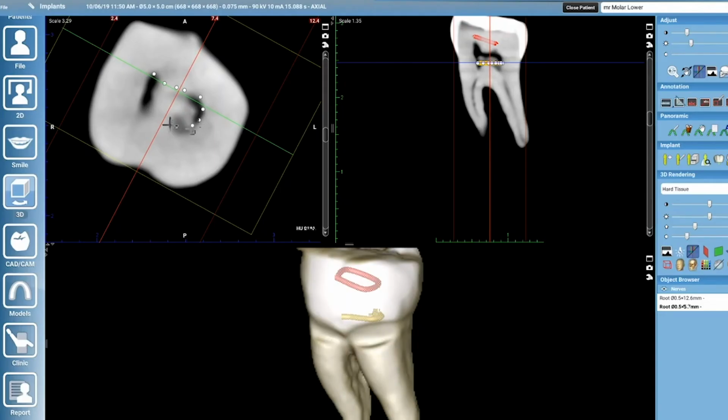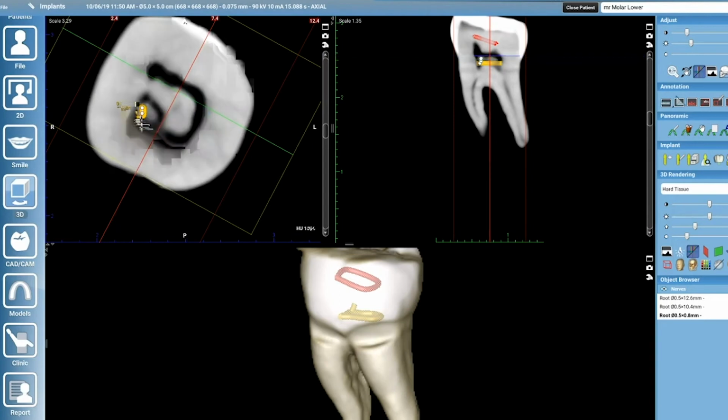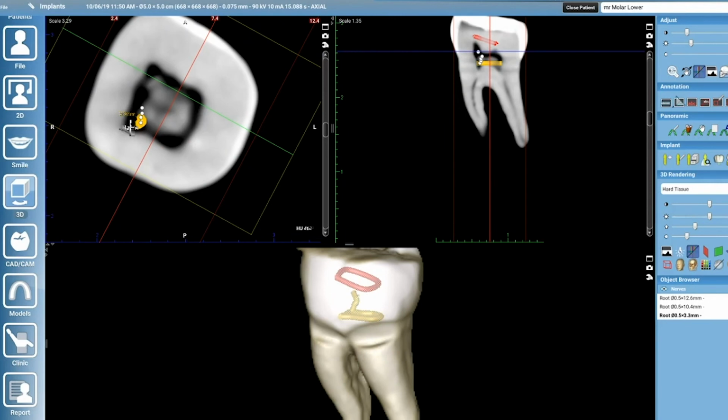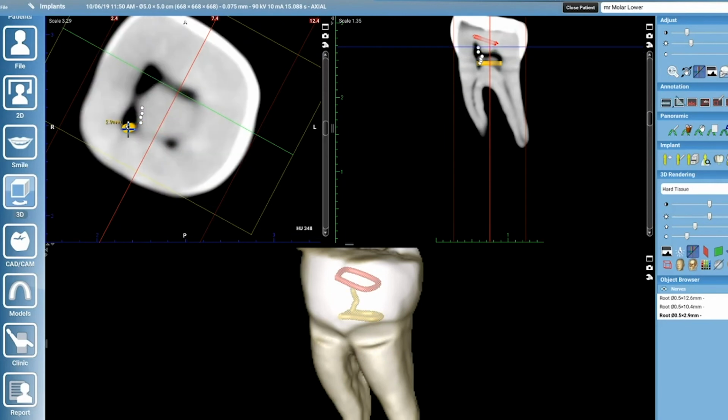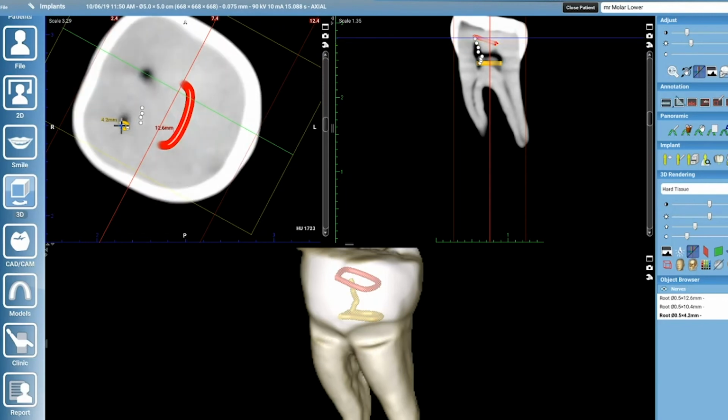something like this, and literally then we'll just join up the sides of the pulp chamber. And so we're just going to join the vertices and see what it looks like. So starting from the pulp chamber floor, let's just do that. Scrolling up. So you can see the path that we're taking is actually quite convoluted.